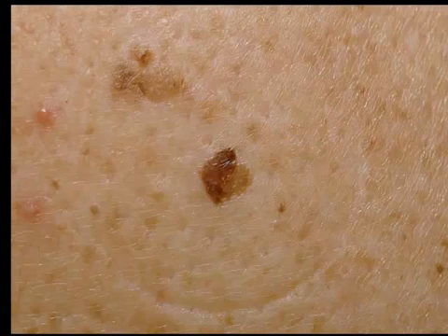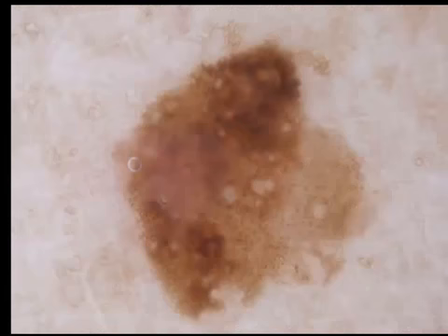Given this pathologic dermatoscopic correlation, we know that whenever we see circles on non-facial skin, there is hyperpigmentation of basal keratinocytes and acanthosis of the epidermis, like in which diagnosis? Seborrheic keratosis. This is a seborrheic keratosis clinically, and here this is the same seborrheic keratosis dermatoscopically. And what you can see is circles and some distorted circles. Distorted means they are ovals or even polygons. Why? Because there is more acanthosis. So circles on non-facial skin are a good clue to seborrheic keratosis, because circles indicate acanthosis.